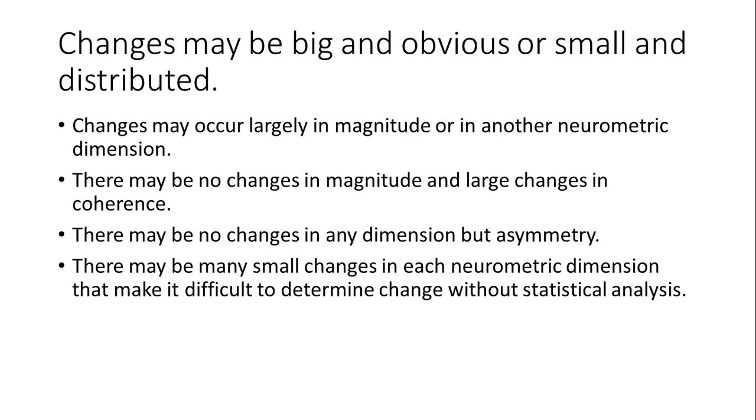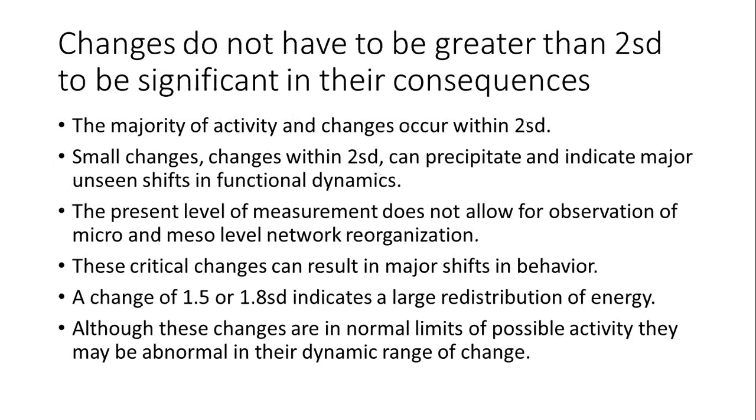And that makes it difficult to determine what the change is without a statistical analysis, and that's why we use the compare tool. You may look at a map and say, this doesn't look that much different, but you look at the percentage of change and you see, oh, this changed 28%. That's pretty good.